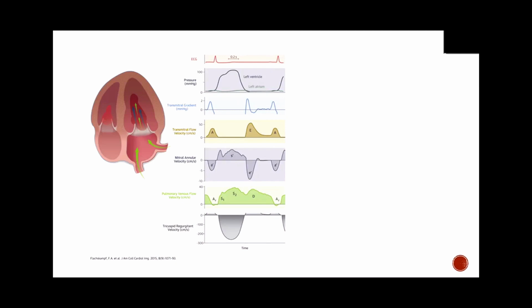So these are the general principal areas we use to assess diastolic dysfunction. Up right here, we see our pressure gradients, which we're going to refer to a little bit. But for the most part, we talk about our transmitral flow here, our tissue Doppler and tissue velocity here, and a little bit about our pulmonary venous flow. What we'll talk about in 2 weeks is our tricuspid regurgitation jet, but it's part of the algorithm here, so I included it a little bit.